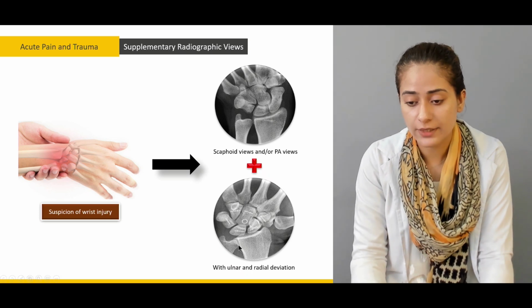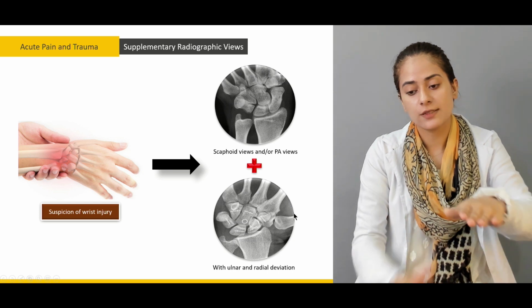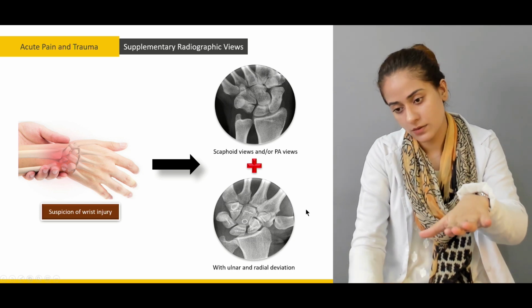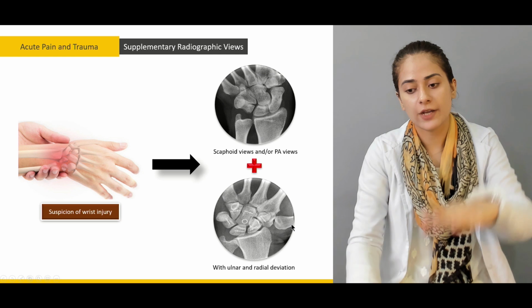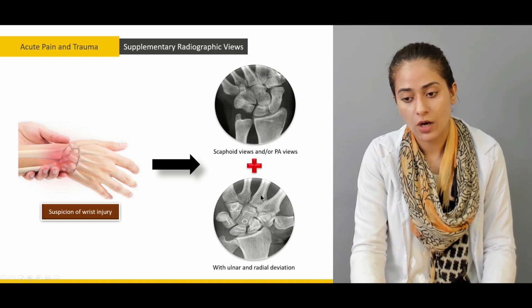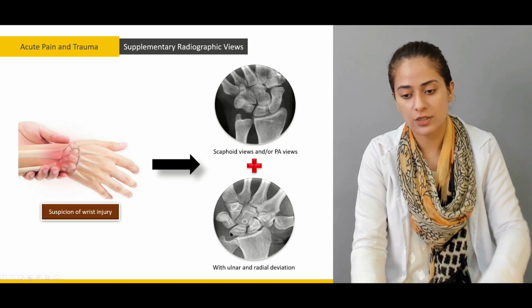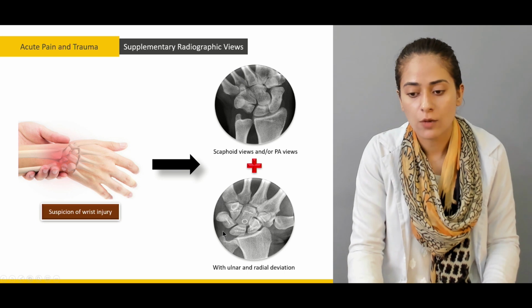So these are all the carpal bones here. So what happens is this is a radial deviation, right? So the deviation is towards the radius, these metacarpal bones are displaced in this direction, and this space here is more than normal.